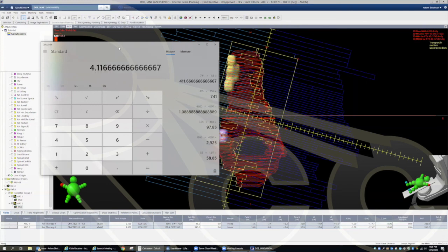That's good, because normally we like below 5 in general. Okay, that's good to know. It's just a parameter. I don't know if it's telling you a lot, but it works. We do it for all of our VMATs, just as a QA. Okay, great. Well, thanks for that information. Learn something every single day. I know, right?